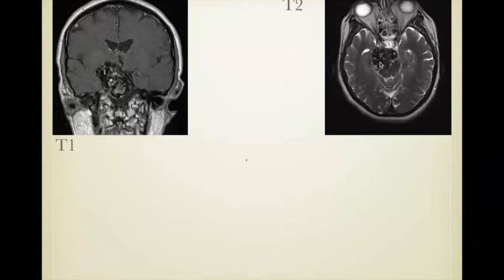This was actually sent in as a chordoma, but of course we know that chordomas generally are of high signal intensity on the T2 weighted scan, and there shouldn't be any rests of high signal intensity on T1, or as I say, areas of T1 shortening in a chordoma. Now, how can we get closer to reaching a diagnosis in a patient like this?